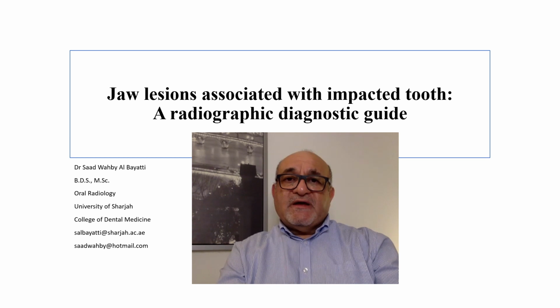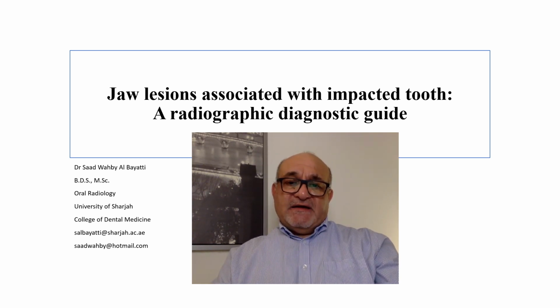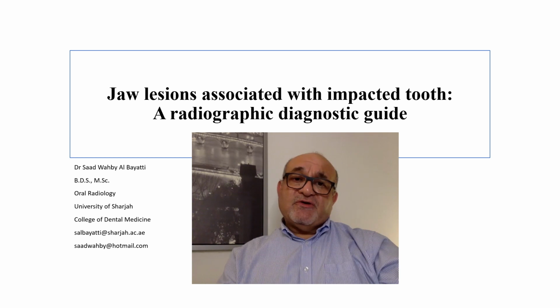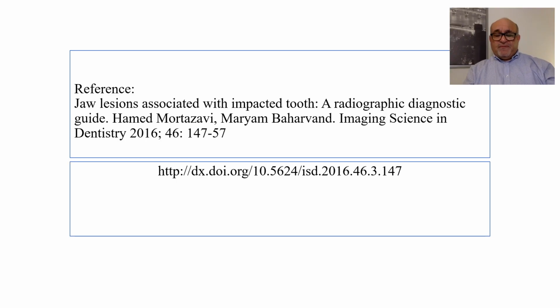What we are trying to do is to have an idea about setting a diagnostic guide for the radiographic assessment. How would we put a differential diagnosis if we see a lesion, whether it was radio-opaque or radiolucent, that is associated with an impacted tooth.